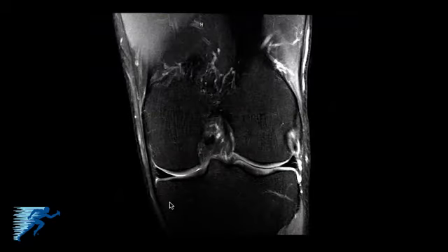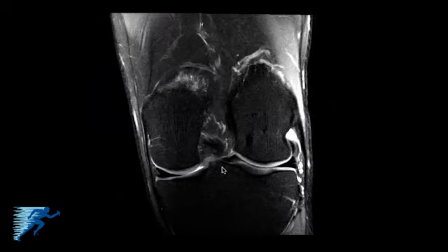As we go deeper, we'll start to see the superficial medial collateral ligament on the medial aspect of the knee, coursing along the tibia. And as we go further back, we'll start to blend back more into the posterior oblique ligament and get to see the menisci and their triangular shape. We can also see the anterior cruciate ligament. Here is the anteromedial bundle of the ACL, and here is the posterolateral bundle of the ACL. The PCL is just starting to come into view.